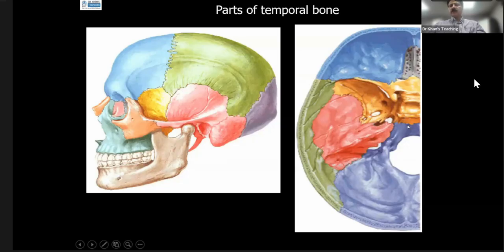We are more interested here. So here in the midline, the basi-sphenoid forms a joint at the clivus, and there is a joint here also. So part of the clivus is made up of sphenoid bone, and part of it is made up of the occipital bone. The occipital bone has various parts, which include, other than the clivus, the condylar process and the squamous part, etc. We are not interested in detail.